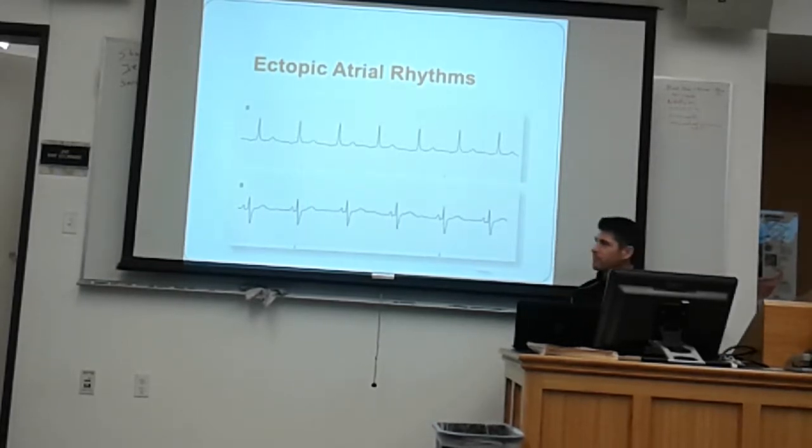Is that a U wave? On the second one? Right here, that is a U wave. Yep, we'll come back to U waves a bit later.